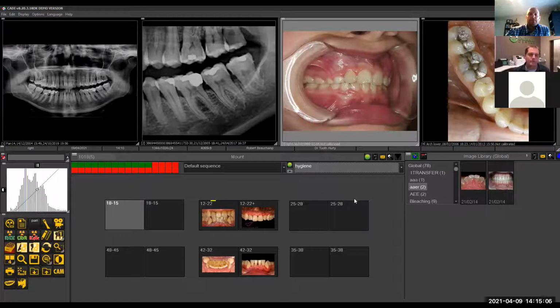You have to toggle between them. Honestly, most people don't want to see full mounts side by side. That's why the way we designed it, for space and for layout, your mount is there, but it's really about getting the individual images up out of them. So that's how we designed it. You can always get that full mount screen if you'd like, but it's 1 mount at a time. It's never side by side. I think it's more the images specifically that they might want to look at side by side, not the whole mounts.